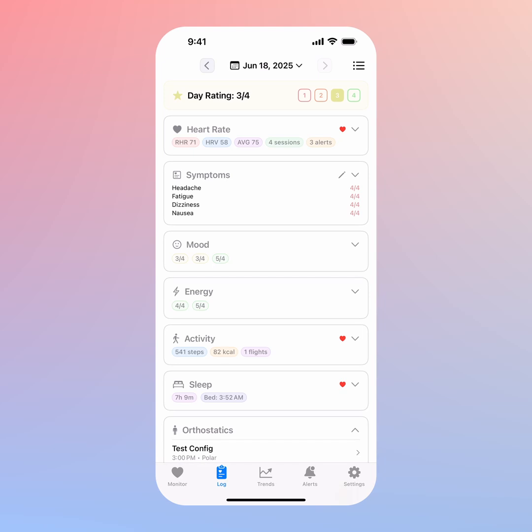Called Tachy. And this is just a quick snapshot, and I'm not going to go very deep today. There's a lot I could talk about, but I think it would be way too long for a quick demo intro video. So just a high-level look at where things are right now, how the app is structured, the main features, and what's coming next.